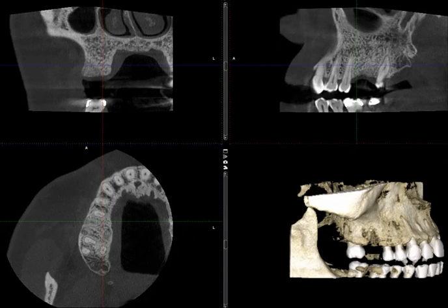This patient is in her mid-50s. Again, I emphasize the gender as well as the age, just because the quality of the bone and the ridge, size, and shape is very impressive in my opinion. This patient was scanned for a dental implant at site number 3.